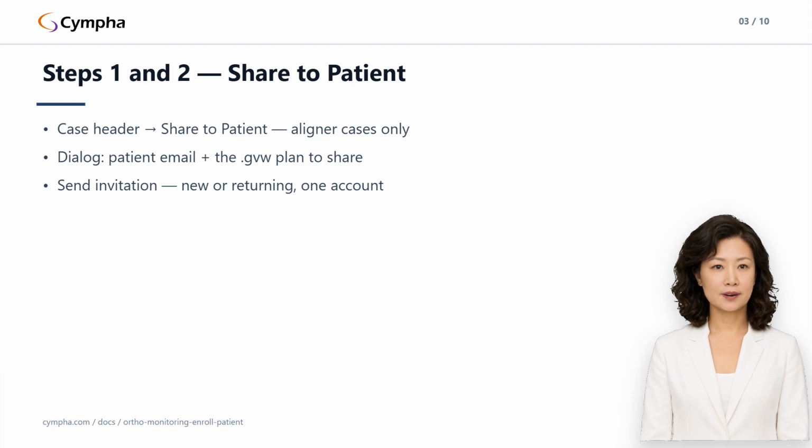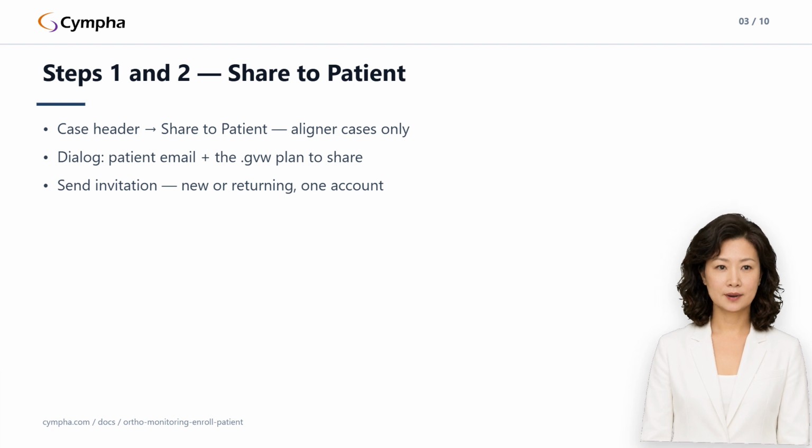What they'll see after signing in is deliberately narrow, a page listing only the case you just shared. No other patients, no other cases, no editing tools. Step 3 happens in conversation, not on a screen, and it's where good enrollments are made.